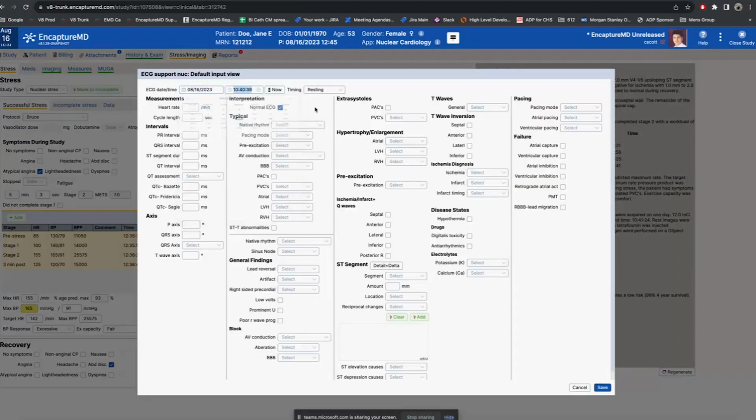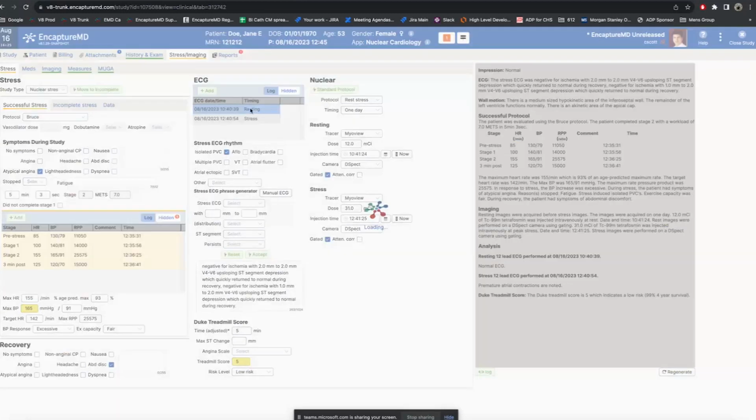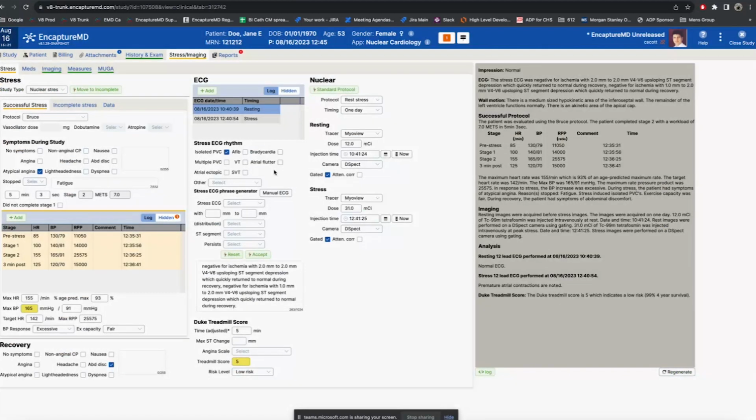So this is what that looks like. And then a stress interpretation. And this is what a table looks like in our system. So there's an output form, and then you can double click on it. In the output form, you can have as many columns and as many rows as you need to. Anything that I put in here, it'll look exactly like that out here.